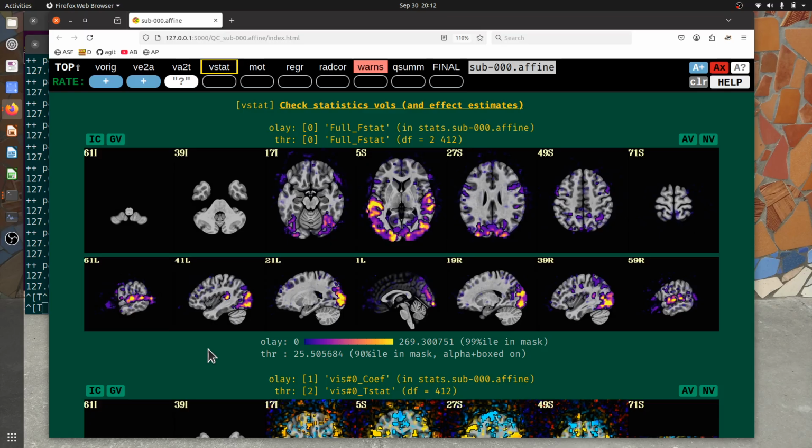There are also some regions that we see outside the brain that we shouldn't ignore. This is part of the fact that even though we've estimated a mask in our processing, we're not applying the mask to our data. We don't want to hide away things just because they're outside the brain, because we're doing science and we want to see the evidence everywhere.